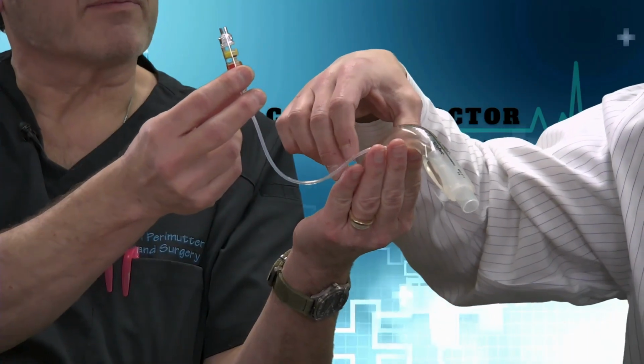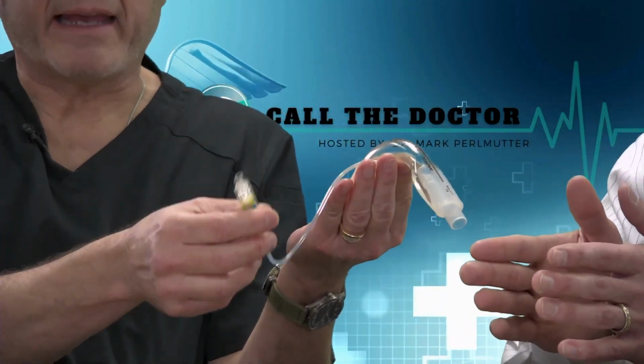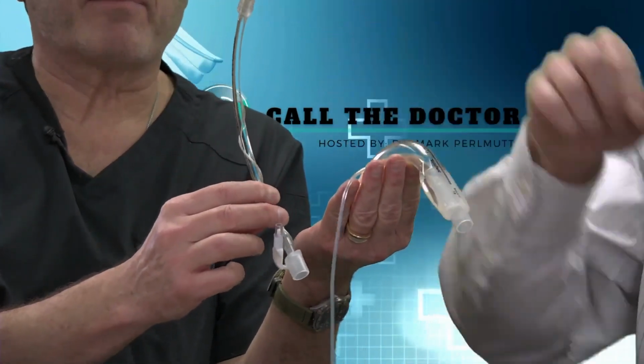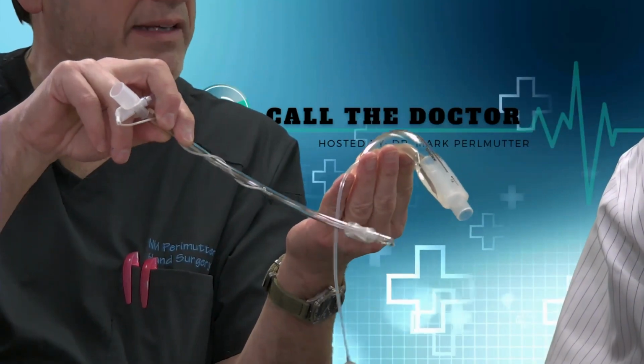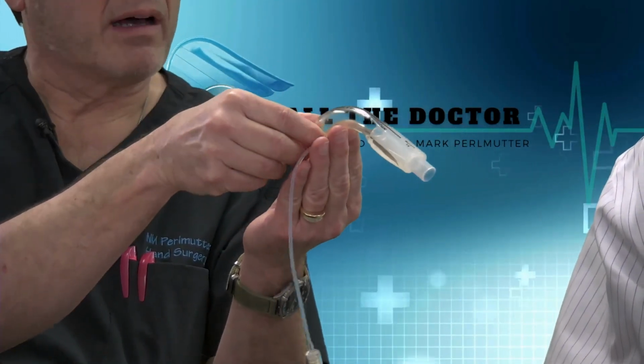Because this device is the shape of your airway and the molding of your airway, and it sits and makes a very tight seal. There's another tube here. This is to put air into this bladder to inflate, to make a tight seal. And this endotracheal tube has the same thing. A balloon cuff here. Yeah, so that will blow up and make a very tight seal. Correct. And so it doesn't very easily pull out.